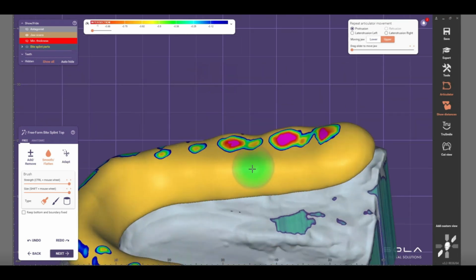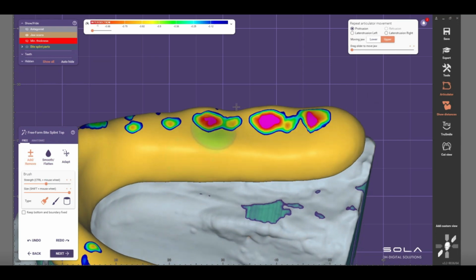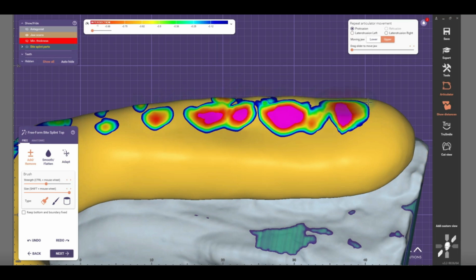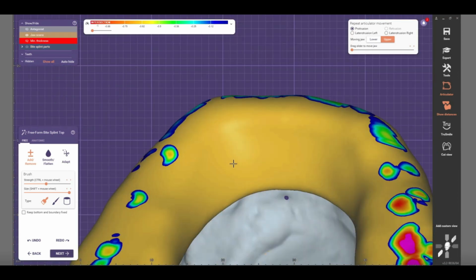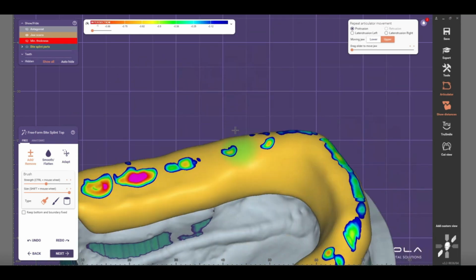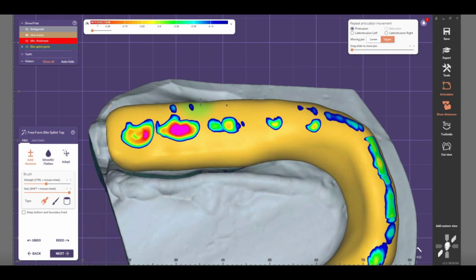Then I would straighten the edges this way. I keep that at an angle and add. I'll do it 50% roughly and keep adding those edges. I'll smooth it out later, but I'll keep on adding now until they are straight again. Add it in the edges. Again, add on this side. Make sure they're added straight.